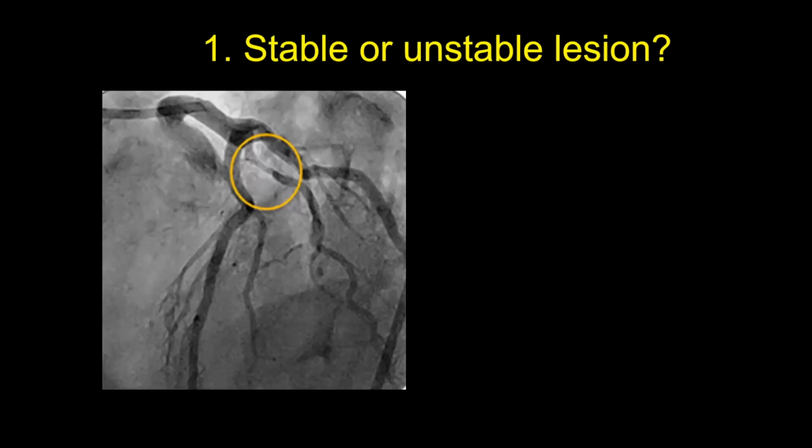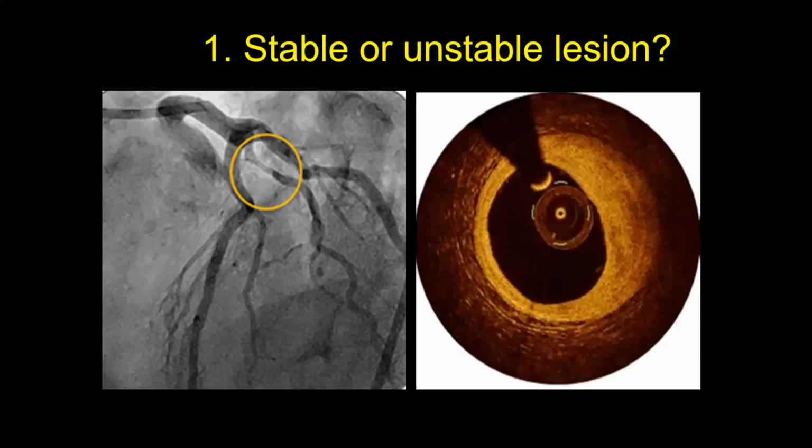But sorry, who is from the attendees? It's Colonel Kumail Gishkori. He is working in QE. Kumail, can you unmute yourself? Are you ready? Okay. Stable or unstable lesion? It looks unstable. Sorry, stable. That's fine. So he got exactly what England did the other day. Missed the penalty, but on the rebound he scored it.